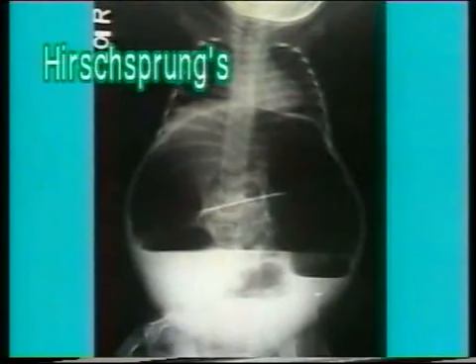In this baby on plain X-ray, the colon is enormously dilated and shows very large air fluid levels. Note the size of the abdomen in relation to the size of the chest. This is a typical picture of congenital or primary megacolon.